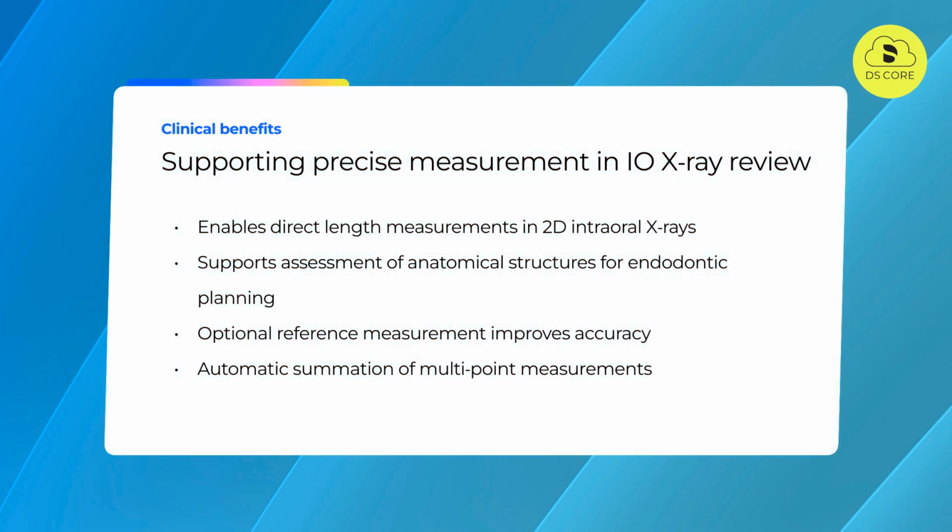The IO length measurement tool provides several important clinical advantages. It allows you to place precise length measurements directly onto 2D X-rays, giving you an immediate sense of case complexity and supporting your endodontic planning from the very first look.